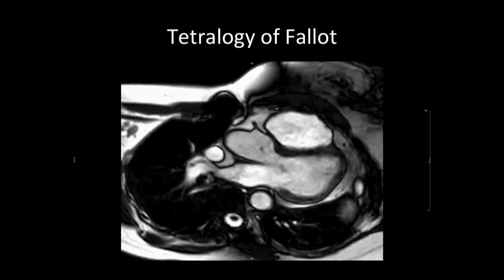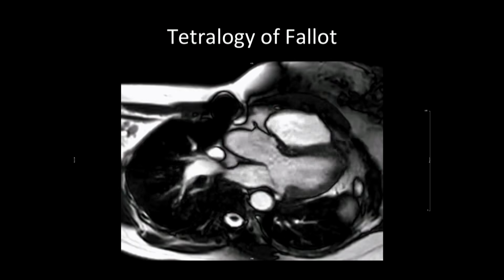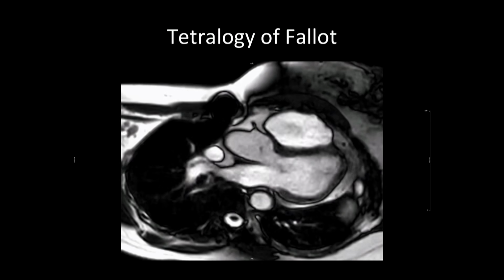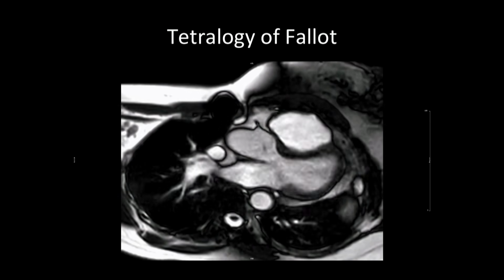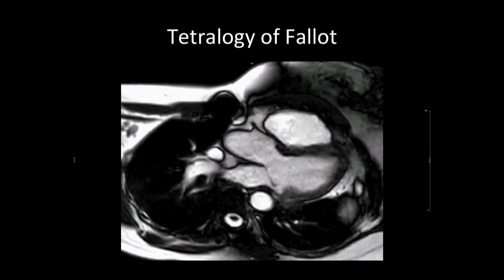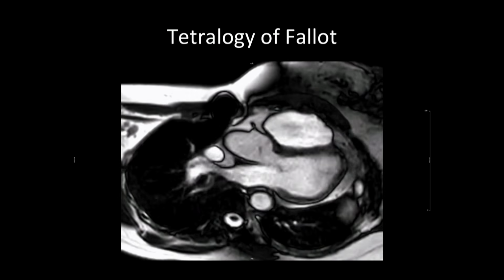This is in MRI. We get very similar views to echocardiography. This is again showing us the LVOT. This would be a 3-chamber view in echo. We see the LVOT and we see the ventricular patch, right? We see that crest.